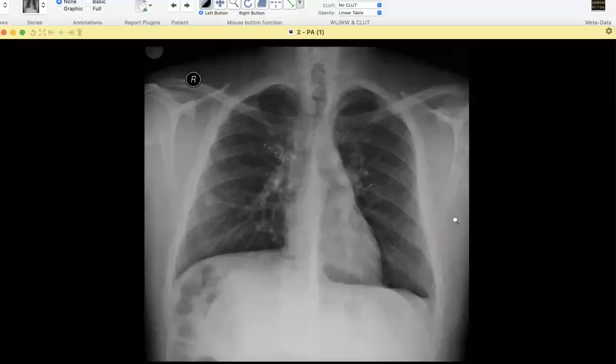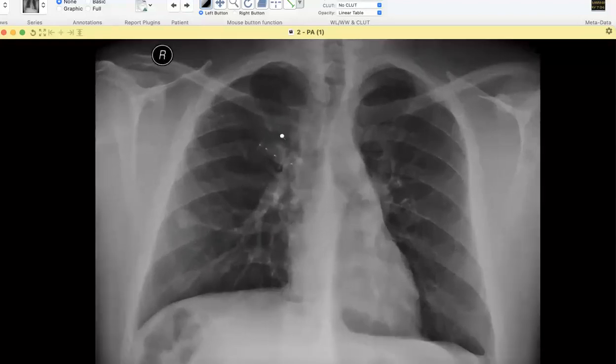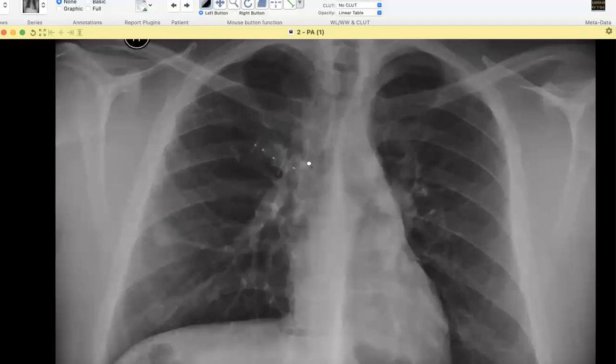So second case, hemoptysis, straightforward, you went for an AVM. Okay, the lesion is well defined, small. There is a vascular pedicle which is connecting to the hilum. No points in making a correct diagnosis over here. However, this is a vascular closure device which was used in this patient to previously close another AVM over here. So likely this patient has multiple AVMs in the lungs.